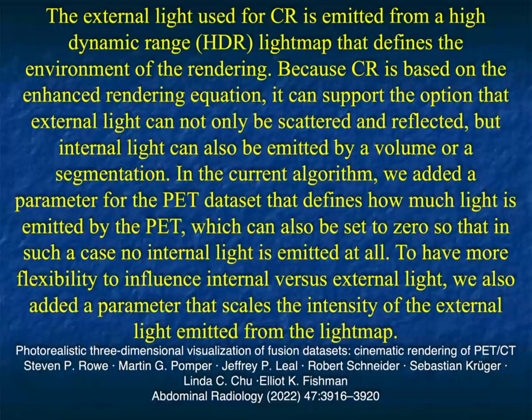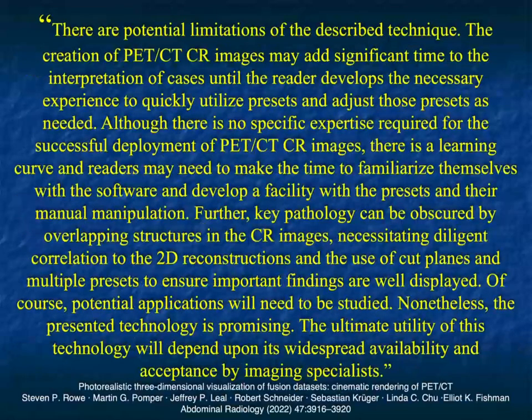Now, it's going to be somewhat challenging. You need to create different light maps, different renderings. I've developed a lot of presets I showed you for pancreas, liver, kidneys, bowel, everything. I don't have a good set of presets yet for looking at multimodality data sets, but I think it's something we need to do. The ability to use lighting models to enhance various structures within the PET and CT data sets will indeed become very, very important.